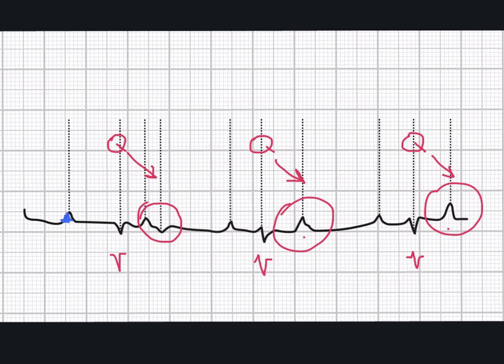Here is one wave that's very clear that this is neither QRS nor T, so this must be a P wave. Same thing here, must be a P wave, and here too. And we see that these P waves have a very interesting shape. They are rather peaked waves, and when we look at the tracing from one end to the other, we see that there is a wave that is rather similar to the P wave, like here, or even here, that there is another wave that could be a P wave.